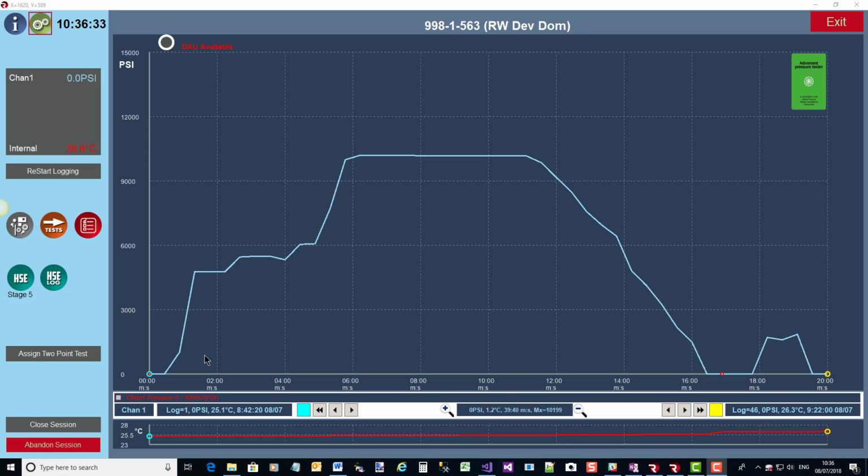Now, what we are going to do is move this left selected point. At the moment it's at 1. We can move it elsewhere by simply pointing to a part of the screen and left clicking there, and this moves the left selected point. So I can change the left selected point, and we can see the associated information changing as I click. When I left click on the screen, the selected point snaps to the nearest logged point that's been saved to the database.